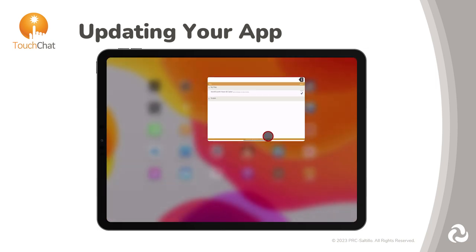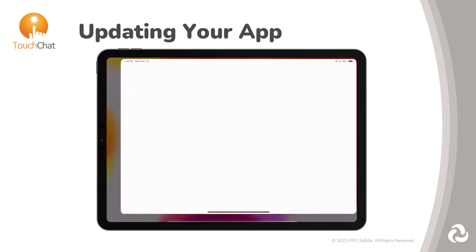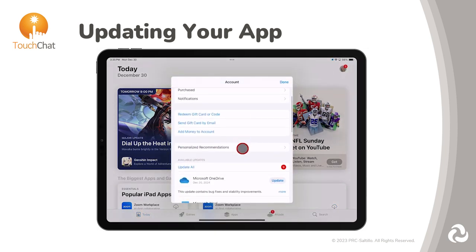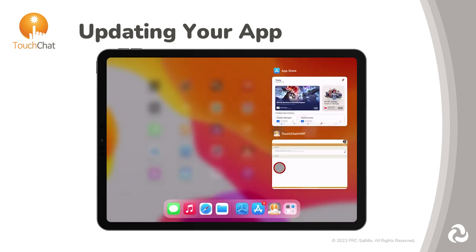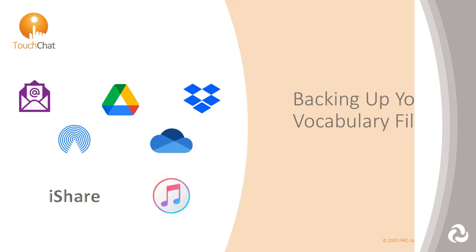To update the app, you will need to go to the App Store on your iPad. Exit your TouchChat app. Make sure you're connected to Wi-Fi in order to connect to the App Store. Go to the person icon in the upper right corner to access your account. Apps that have available updates will be listed here, and tapping on Update will begin updating the app. Exit the App Store. Once the update is complete, go back to the TouchChat app icon.